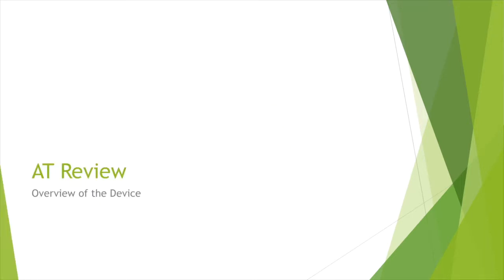First, we have the assistive technology review portion. I'll give you an overview of the device, what it does, who it's used for, some features and functions. Then we'll go into some screenshots and videos of how to set up and get started with the application and what the website has to offer. And we'll go into a demonstration portion of the presentation.